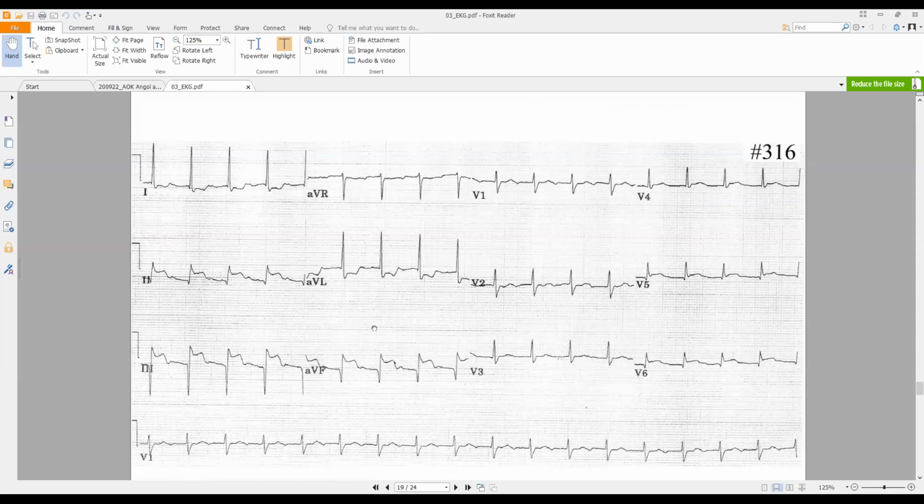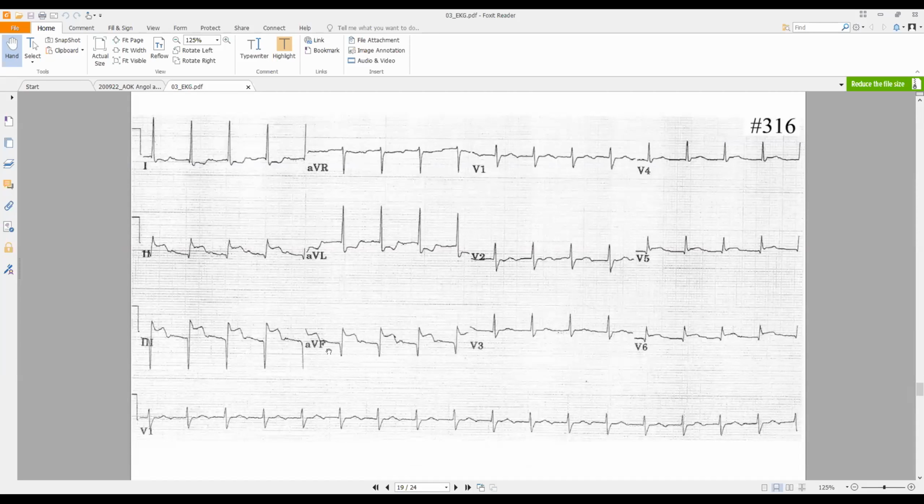I'm not sure about this because lead 1 is positive, but if we look at aVF here, mostly positive, I guess. Well, let's make it equiphasic. So it could be normal, but it could be a left axis deviation. You can say 0 and normal, it doesn't matter.